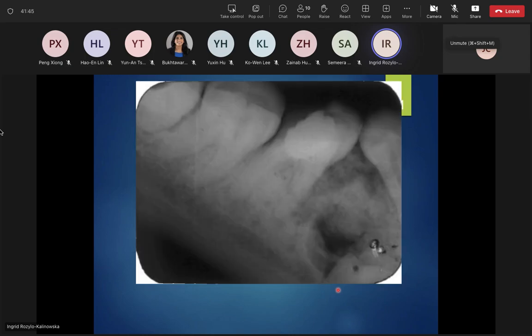atypical. So this was our case, an incidental finding, in fact, because there was investigation of a second premolar that was missing in the dental arch. So a periapical was taken, and it could not demonstrate the whole lesion, as the lesion is between the teeth, but also outside the range.